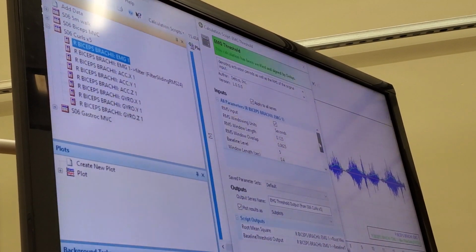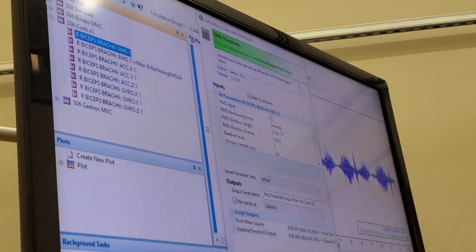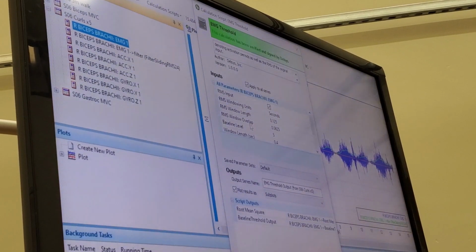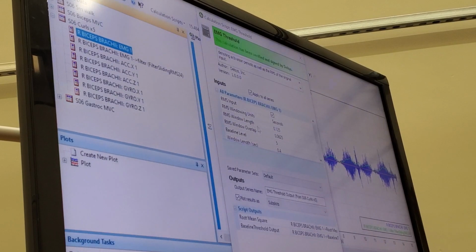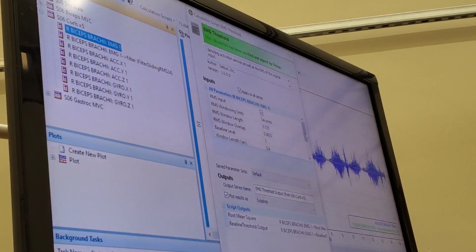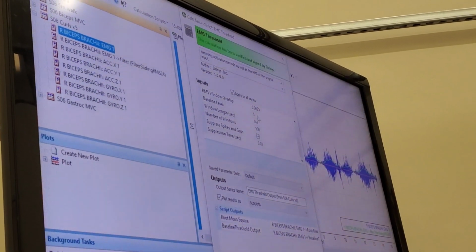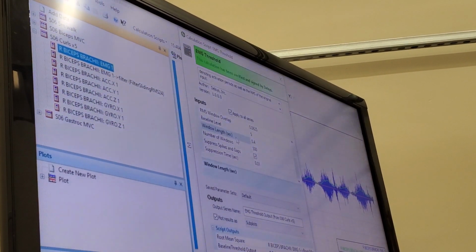So you see this dialog window. We have a lot of the same information as in the previous analysis that we did on Tuesday. So you see we're putting in a lot of information about the root mean squared, right? So that pretty much stays the same as you would normally want it for the standalone RMS. And then the two things that are actually relevant for us to pay attention to are the baseline level and the window length.